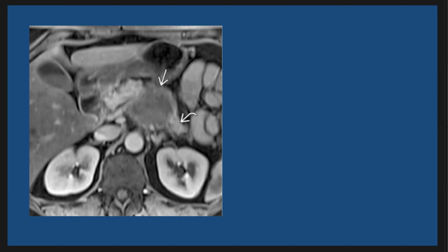This is a new case discussion, and we have discussed in this axial MRI, CT, MRI axial view. After contrast, as we see here, we have a pancreatic mass, hypointense pancreatic mass, in the region of the body and tail of the pancreas. And the mass is breaking through the pancreas to the adjacent soft tissue.